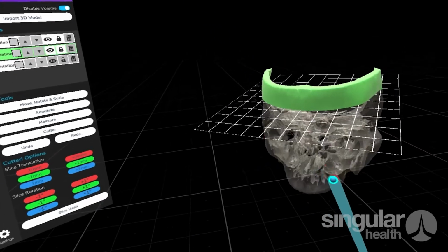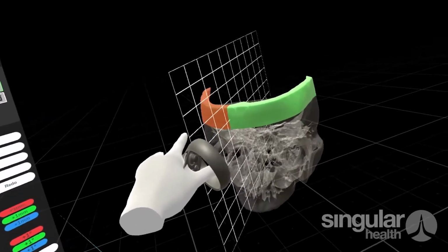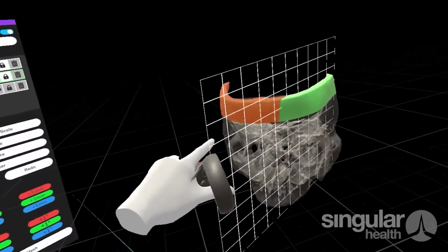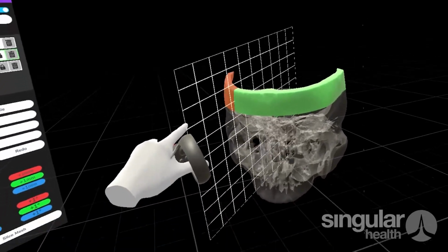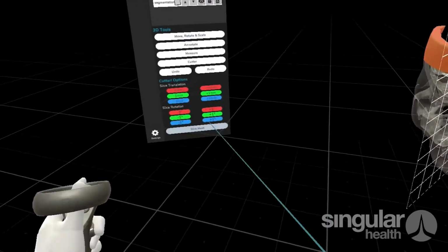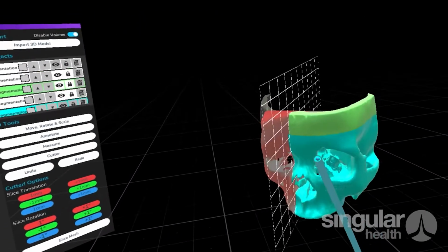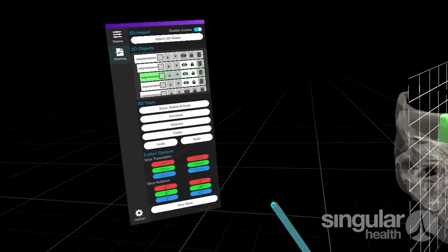As you can see, now it's been sliced, and we get a really nice representation of the current object that is being sliced, and everything else is just faded and hidden away whilst it's being used. And if we want to do another slice, we'll do another one. There we go. And you can now see we've got several components that have all been sliced up.